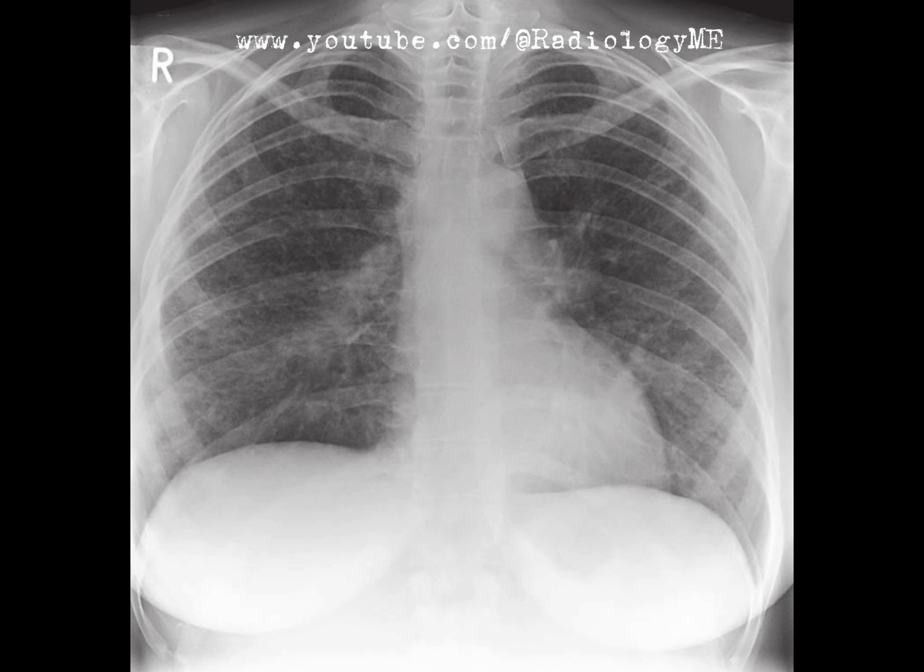To wrap it up, I'd advise respiratory referral, particularly with high-resolution CT scanning of the chest to further assess the lung parenchyma and lymph nodes. Sarcoidosis remains the leading diagnosis, but we would want to exclude other causes of granulomatous disease.